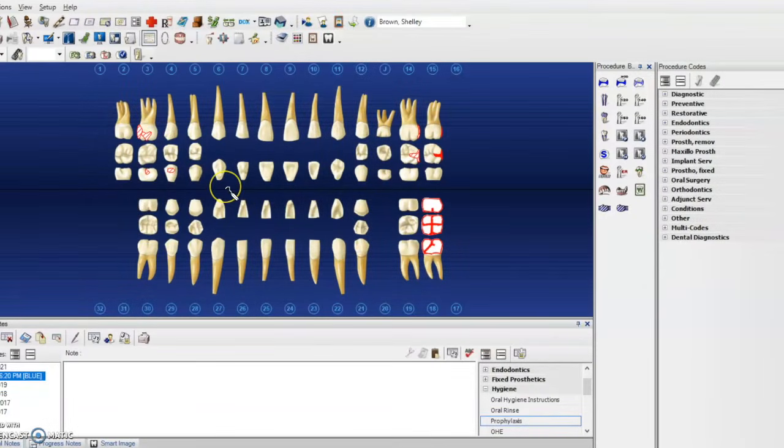You're putting hard tissue findings into your Dentrix chart. One thing you can use to either help you save time or if you're feeling confused is look up here, in here, and there's this little button. It's supposed to look like a little light switch.